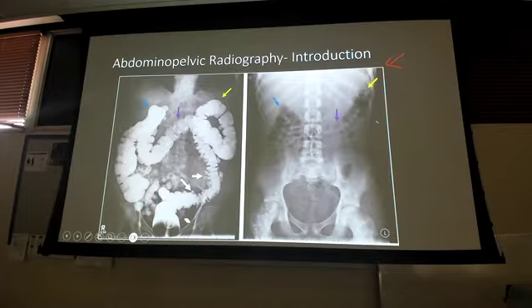But secondly, see all these little white pouches here? Diverticula. That's a large bowel issue. Again, I can have my general shape, hepatic flexure, transverse colon, sure it's a little funky, but splenic flexure, descending colon, right? Whereas the small bowel is like, it's all sitting in here, right?